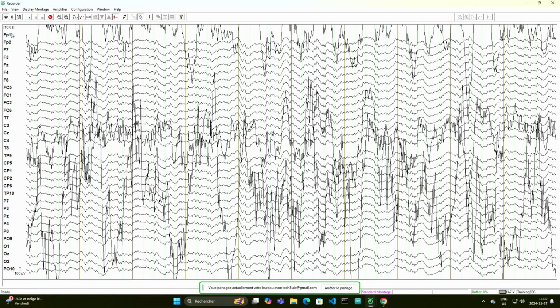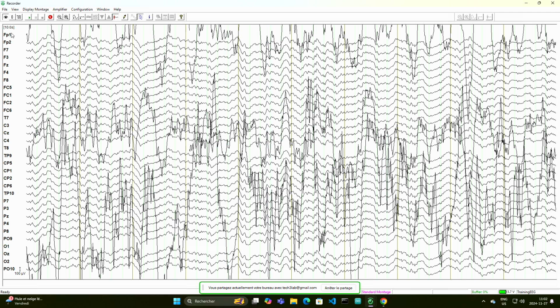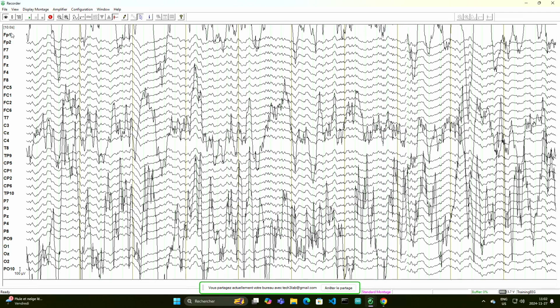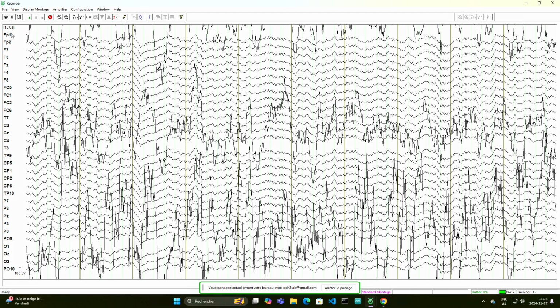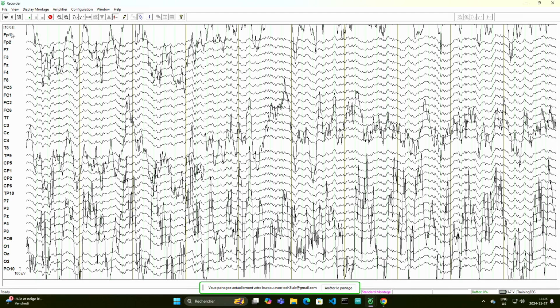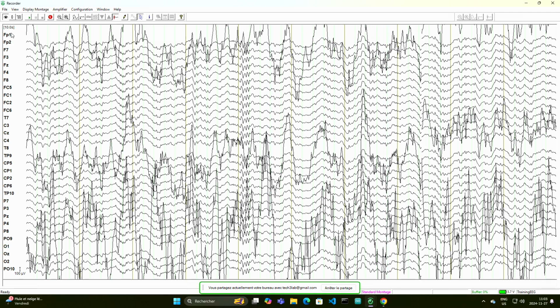And potentially at this stage, we could even change out the electrode bundle if there were multiple problems. At this lab, we do have multiple bundles available. So if you decide that the costs of losing certain electrodes are too high, we can always replace the bundle and we can have the broken one repaired.